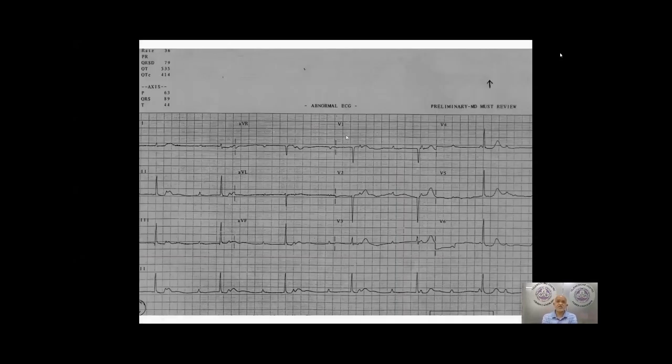This is a typical ECG of the patient. You can see lead 2 of a patient with congenitally corrected TGA, a classical ECG. Any child who is cyanotic, blue, who has bradycardia, suspect congenitally corrected TGA. And the clue would be that the patient has CHB. You can see in lead 2, the QRS is there, this is the P wave, this is the P wave, this is the QRS wave. So complete AV dissociation is there, very strongly suggestive of complete heart block.